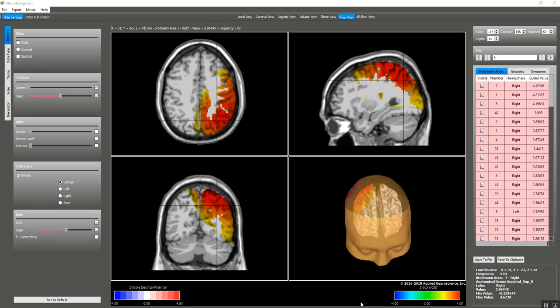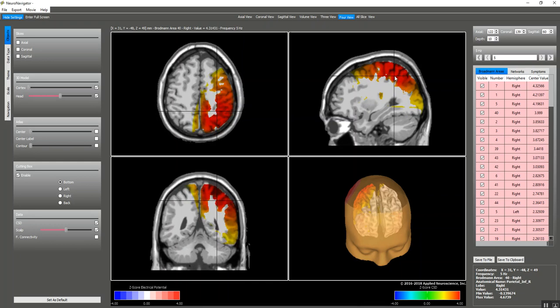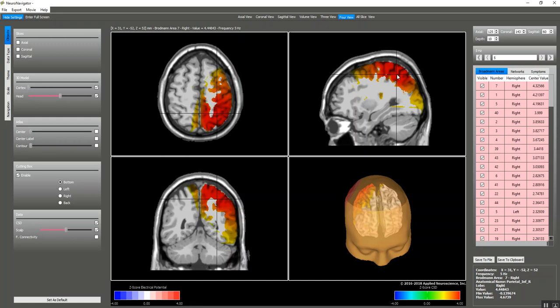This is a video of the update to the NeuroNavigator, particularly an update to the navigation panel itself with different controls and improvements in the way it looks, its aesthetics. The basic engine behind the NeuroNavigator, that is the sLORETA, the physics and mathematics of the engine have not been changed, but the way to see the slices and the location of deviant z-scores and current densities, etc., has been improved.